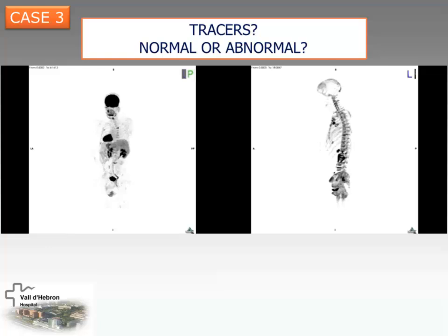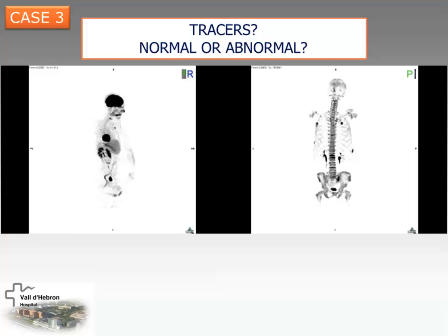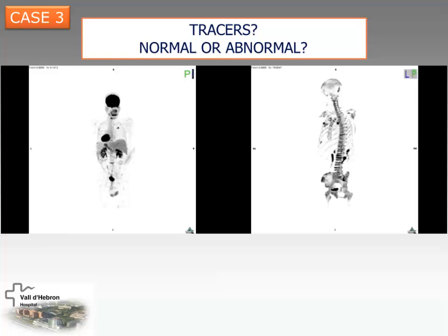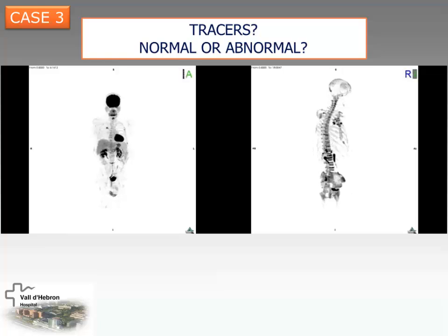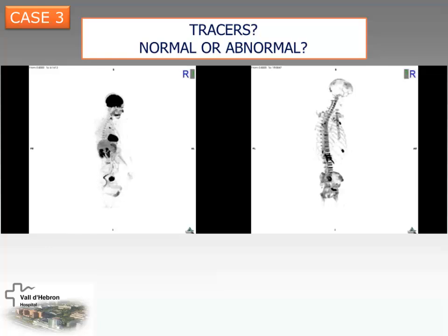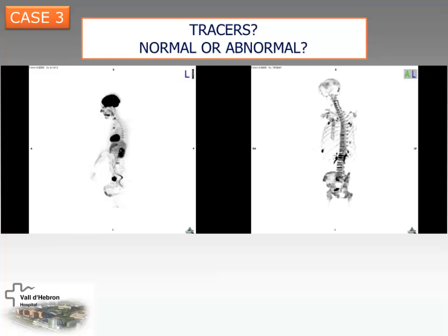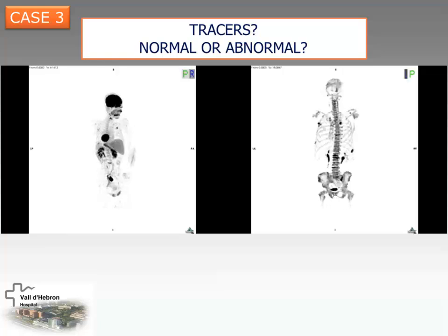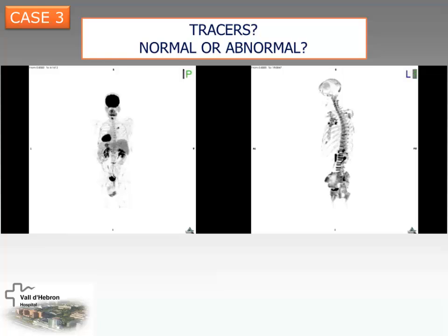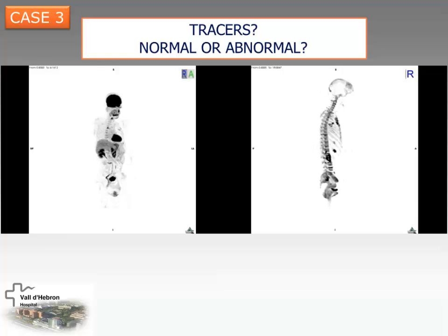Many. Yes, skull lesions, vertebral lesions, costal lesions, in the pelvis also, yes? And with FDG, can you see any of these lesions? Few. Fewer lesions than with fluorine, yes? And you are working with adults.